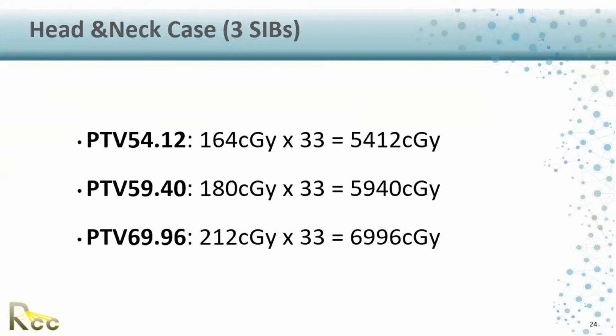But it will give you an excellent dose control from the periphery of your PTV to the surrounding tissues. This is very crucial. So I don't mind spending another 15 seconds on the treatment while I'm achieving excellent dose coverage and protecting my organs at risk. Some people will say, oh, the integral dose will be a little bit higher. No, it's not that much really. It's less than 5 to 10% for the worst case scenario. So sometimes you have to make compromises between things to achieve the goal.